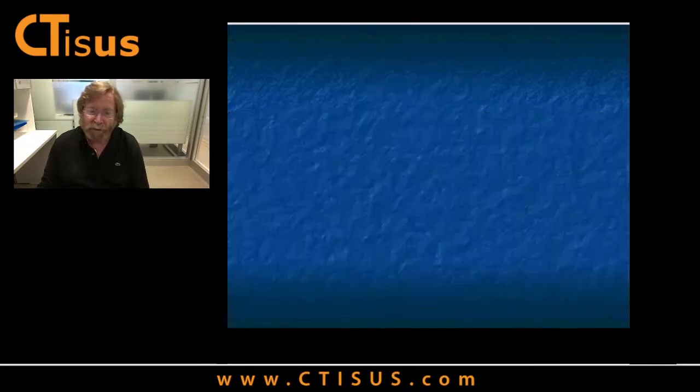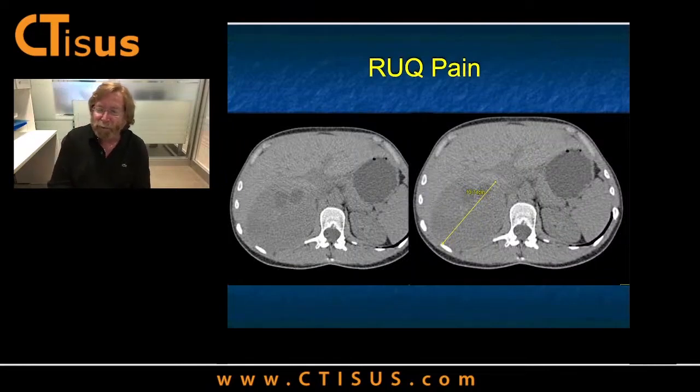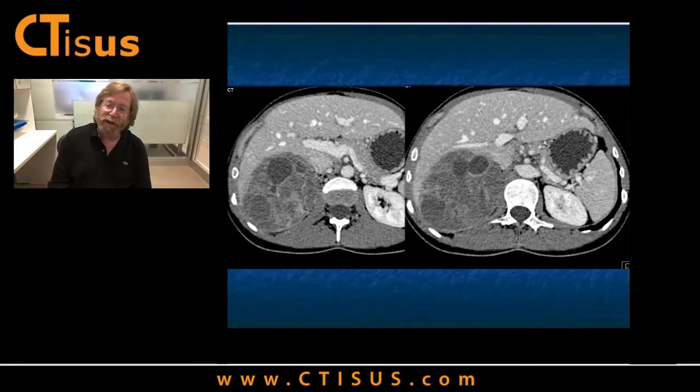Okay, looks like I'm really sticking with the adrenal in this series. Another patient, right upper quadrant pain. Big solid mass, maybe there's some cystic components. This is the non-contrast. Here it is with contrast. Lower density cystic, but a large mass. ACC possible. Cystic Mets, I guess it's possible. Lymphoma should not be cystic like this. That's less likely. But I gotta think of something.